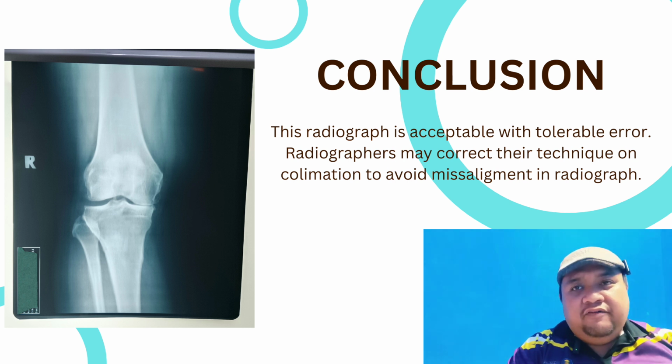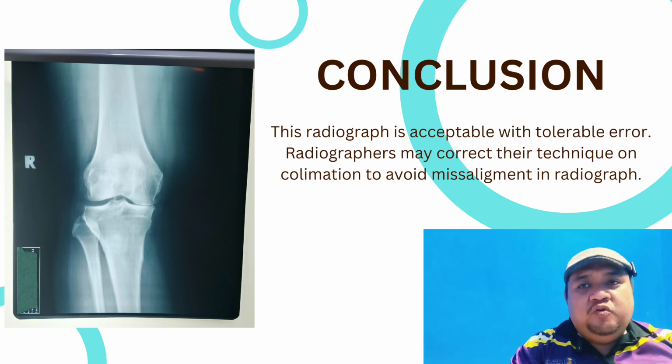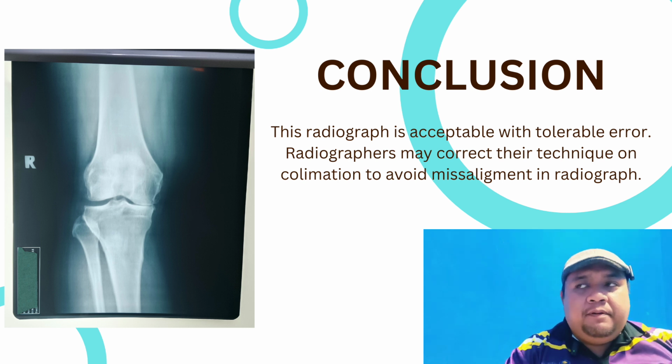As a radiographer, we must aim to improve and be consistent with beam limitation, and we must ensure every image prioritizes diagnostic quality and patient safety.